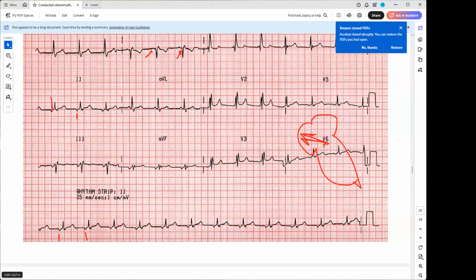The atrium is activated exactly the opposite way. So that's the junctional escape rhythm or junctional acceleration because the rate was around 90, yes? Because you have exactly the opposite activation of the atrium. It's not a sinus activation for sure. So that's a junctional rhythm, okay?